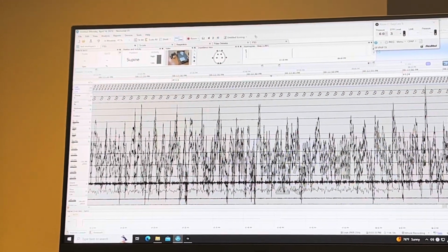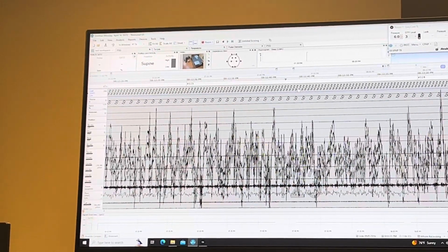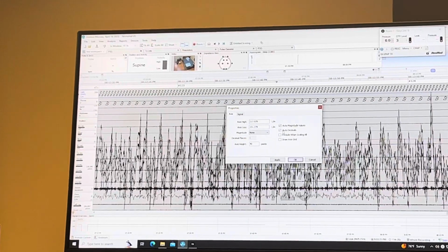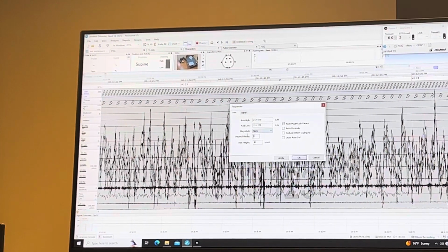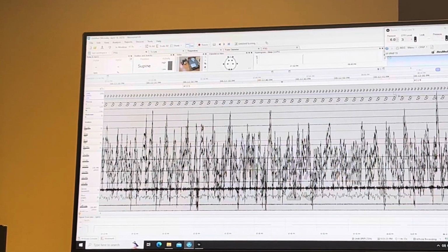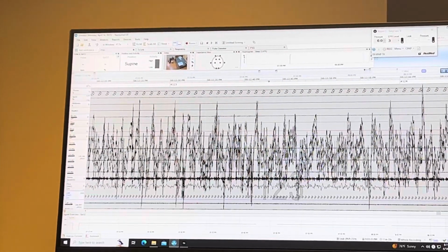And then if we look at the numbers, they've got all these decimal places. So if I go into the properties, I can say I don't want automatic decimals, and I want decimal places 0. And then it'll make it whole numbers for your leak, and then you can take it and put it wherever you want on the screen.